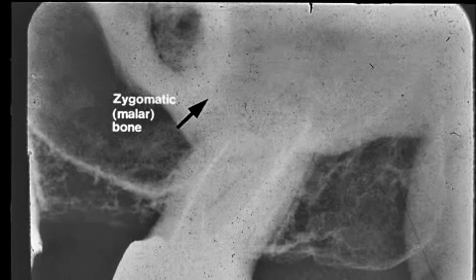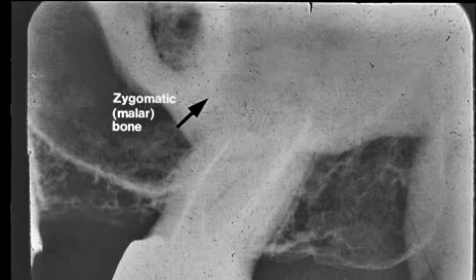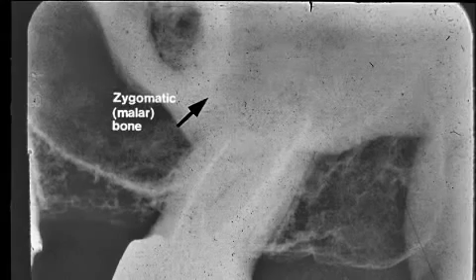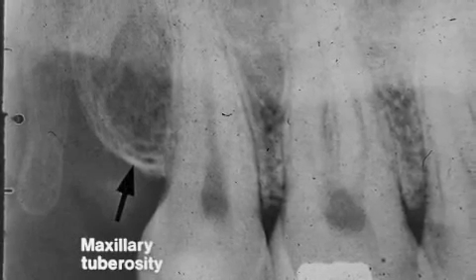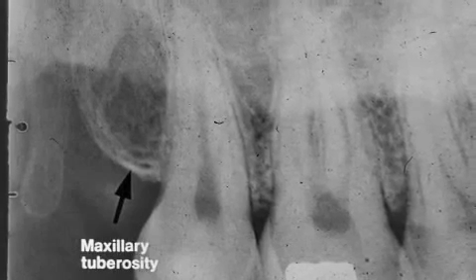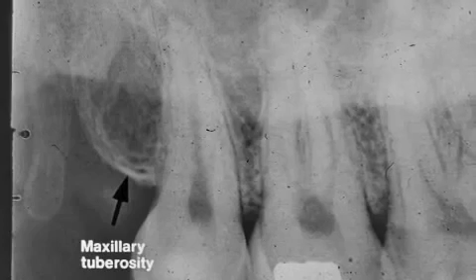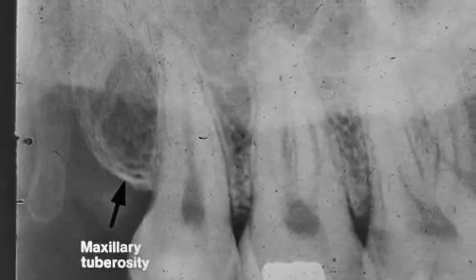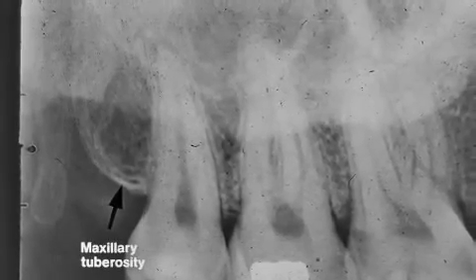And right above the arrow is a radiopaque U shape. This is the zygomatic process. The zygomatic bone extends posterior from the process. The arrow points to the maxillary tuberosity. It curves upward behind the last molar. Posterior to this tuberosity, you can see an extension, the hamulus. It is an extension of the sphenoid bone and sometimes called the pterygoid hamulus. They are radiopaque.